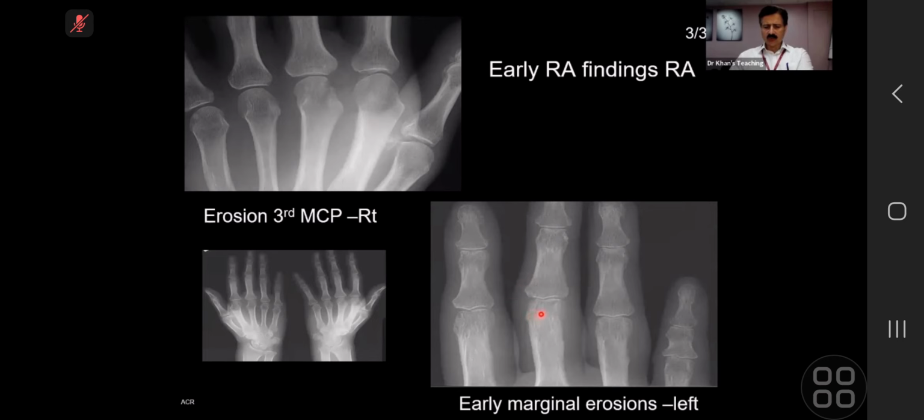And you can see on this digit, there is a bit of soft tissue swelling. Please remember that soft tissue swelling is a key thing to pick up in the exam. And that will be an indicator to look for something. Now, if you look carefully, look at this articular surface, which is slightly sclerotic, and you can see that there is a lucency here.